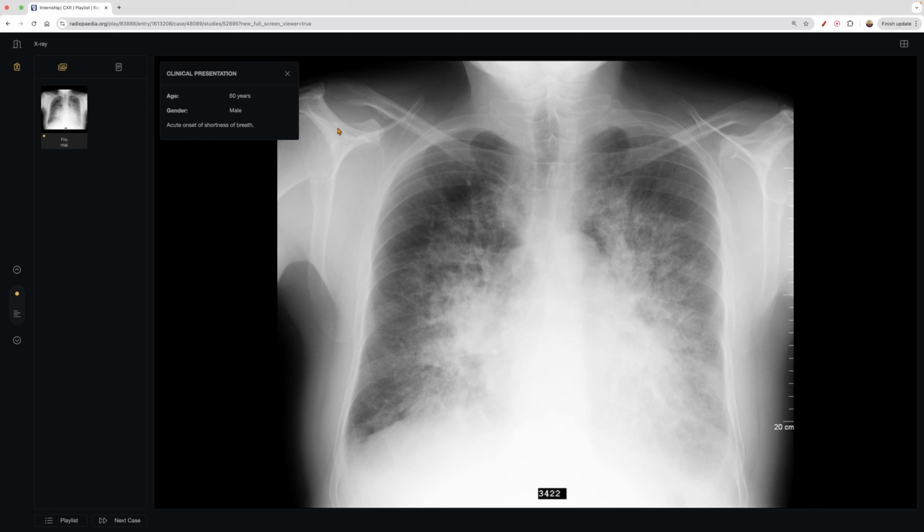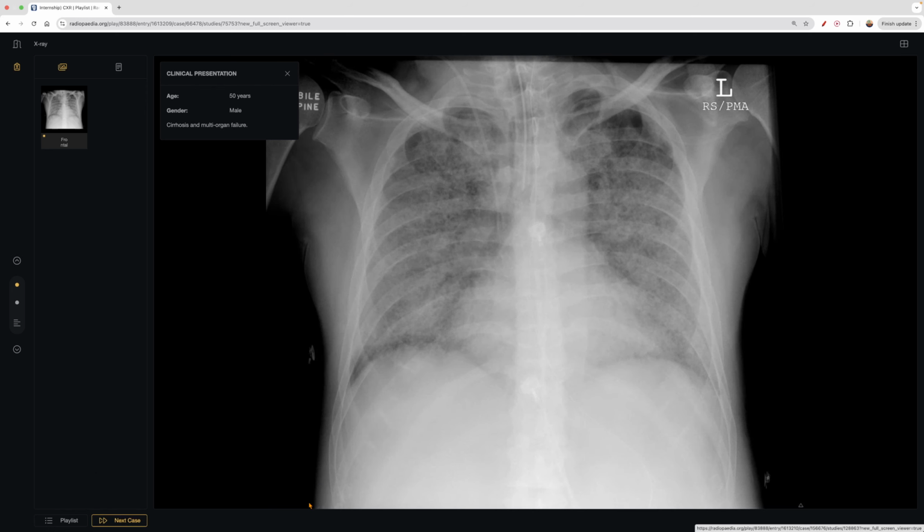And then another key thing to note, clinically at least, for patients with acute congestive heart failure, is that their image typically looks pretty bad. And then after you give them some furosemide, some kind of diuretic, you diurese them, control their sodium, monitor their weight, and all that good stuff, their imaging looks better really quickly. Pneumonia will not do that. So that's another key finding here.